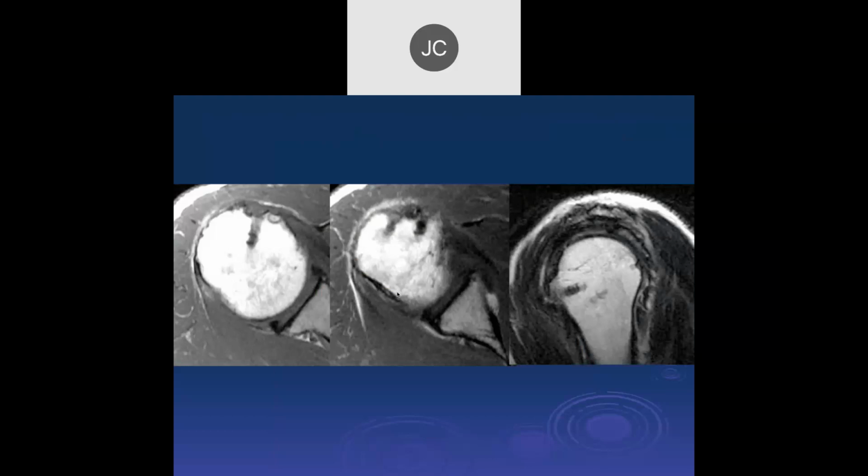Okay, so there's been some postoperative change in the bicipital groove, maybe a bicipital tenodesis. Right, this is the biceps tenodesis. Up until recently, most biceps tenodeses were done by an open procedure where you would go in and attach the biceps tendon down to the proximal humeral diaphysis externally.